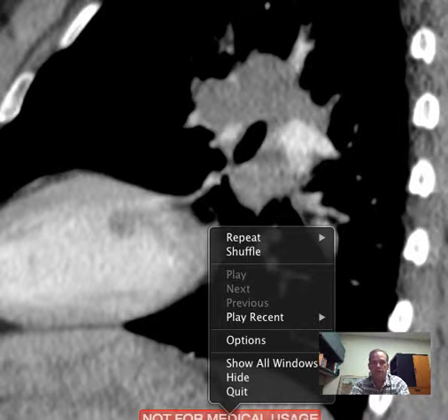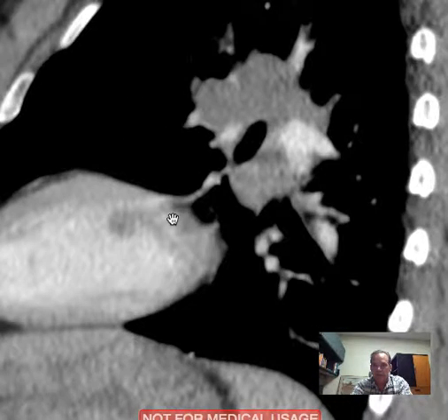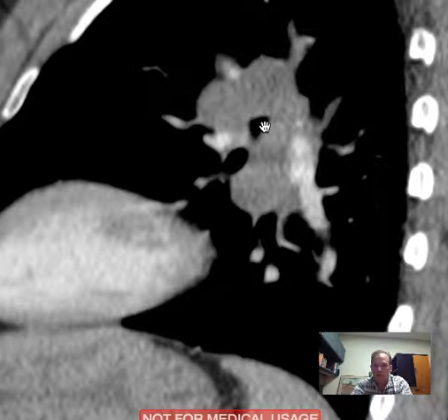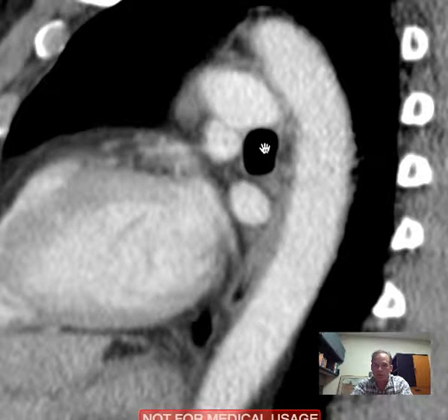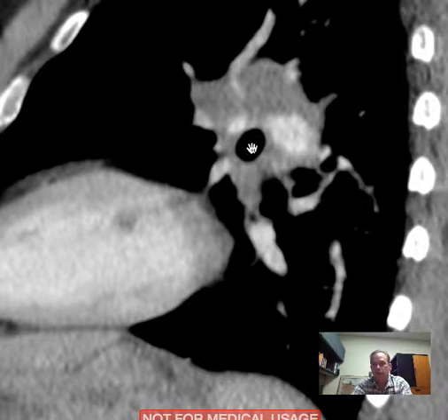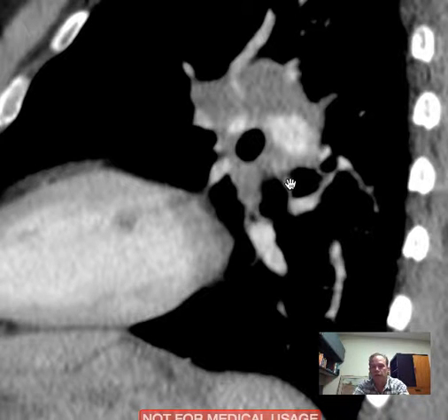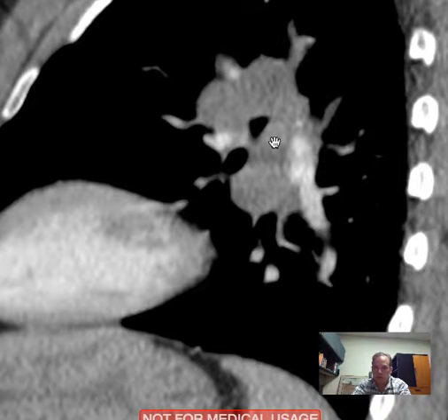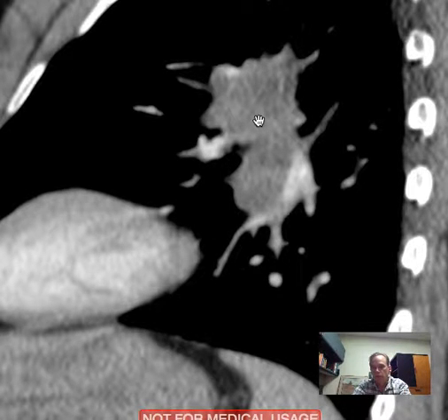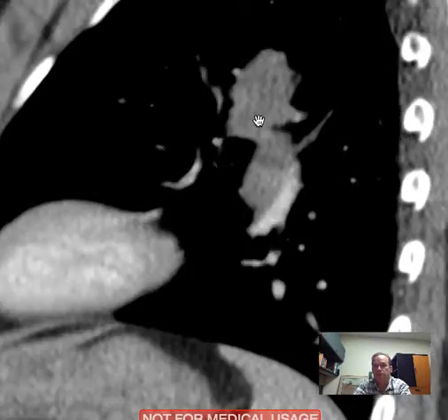And it gives you a pretty nice depiction of what we have here. So we're going out and we come in. You can see the bronchus here, the left main stem bronchus coming out. It divides into left upper lobe and left lower lobe bronchi, and this one looks like it's narrowing there, and then it's completely occluded. So what's a little surprising is that at this point, this patient doesn't have left upper lobe atelectasis with an occluded left upper lobe bronchus.